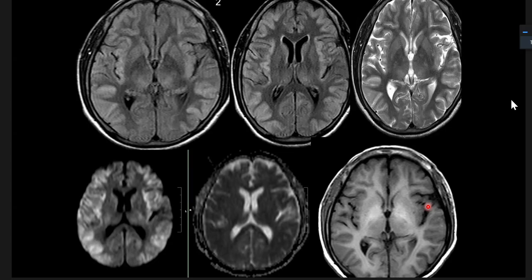T1 bright means there is shortening. Yes, paramagnetic deposition. Excellent. So paramagnetic deposition could be related to iron, hemosiderin, metabolic causes, or total parenteral nutrition etiology. So GP bright means now you have bilateral symmetrical GP and cortical swellings. What are your thoughts now? Metabolic cause, like iron manganese deposition. Iron manganese deposition is suggested only on this basis. What are all these features suggesting, with so much cortical swelling?